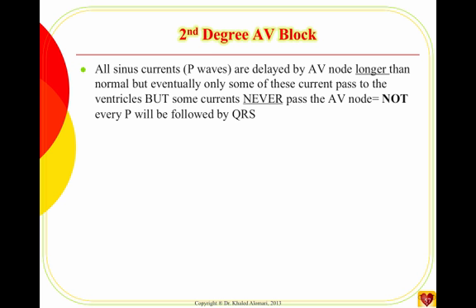The gate opens to let some of the cars get out. Imagine every car to be a P, and then the gate starts closing abnormally. As the gate is closing, some of the cars will pass and then eventually it will stop. The gate will close and will hold 1 P, and it doesn't let it pass down to cause a QRS.